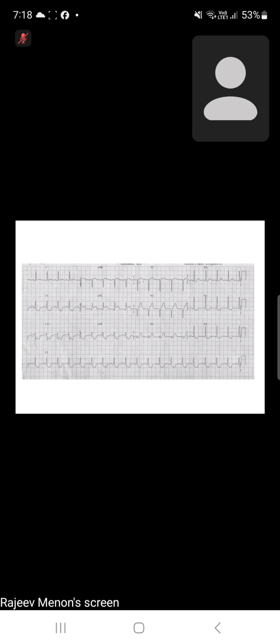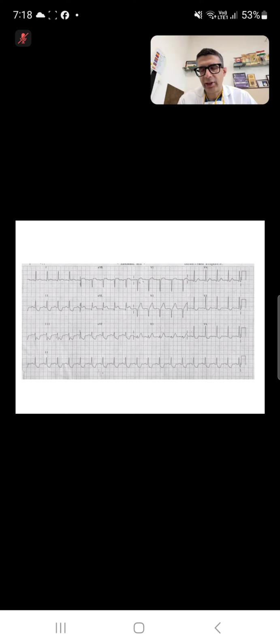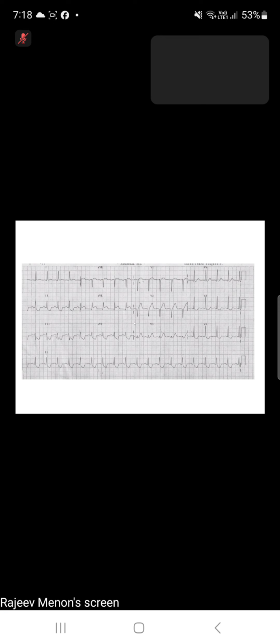Probably 110. Yeah, so it's around 12, 12 into 12 is around 144. So it comes to 1500 if you take. It's around 120 probably. Yes, sir. Okay. Then heart rate of 120. Then rhythm.